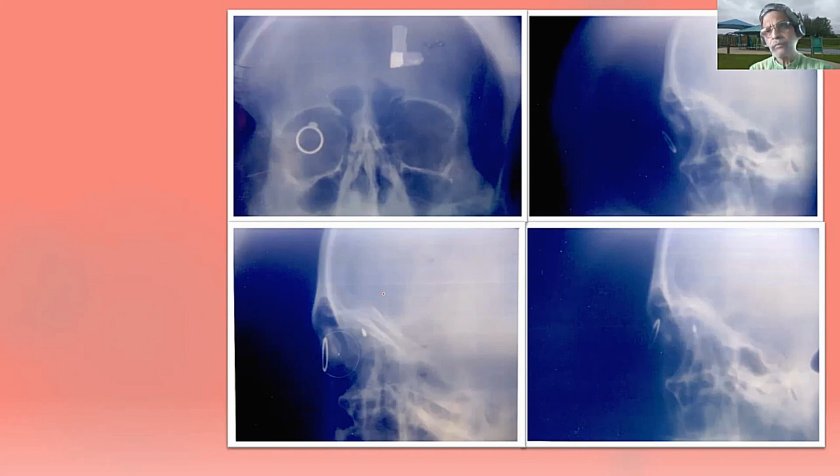What is pathological calcification? Sir, it can be toxoplasmosis. Toxoplasma can produce calcifications in and around the sella. Or the internal carotid arteries there can have curvilinear calcifications because of atherosclerosis. So curvilinear calcifications in the internal carotid artery can be seen as a calcified area around the sella.